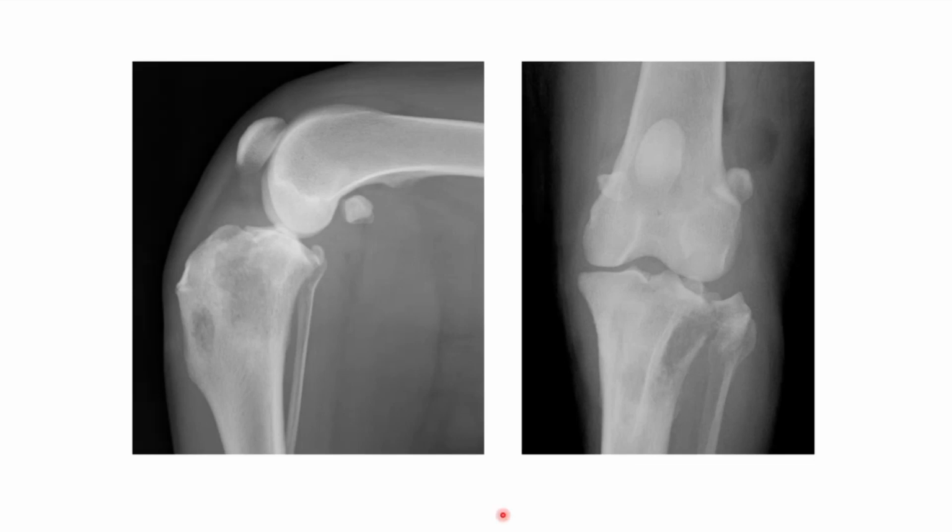Hopefully you guys can see that the region of the proximal tibia is very abnormal, and it's abnormal on the lateral aspect. And it's abnormal because the radiopacity is reduced. So I think we can describe this as moth-eaten lysis of the lateral tibia, and it extends towards the lateral tibial epicondyle.